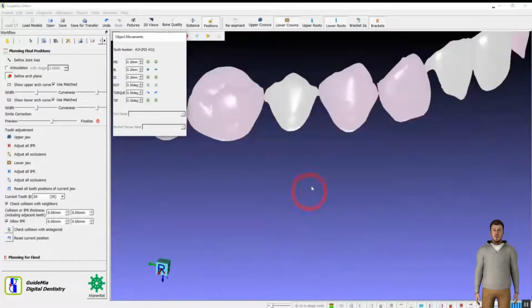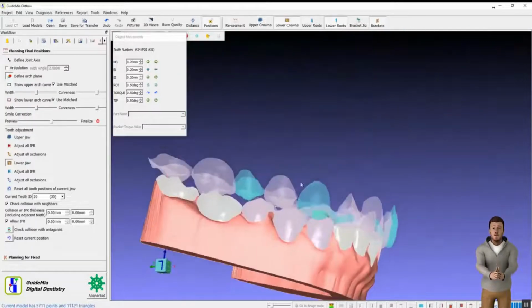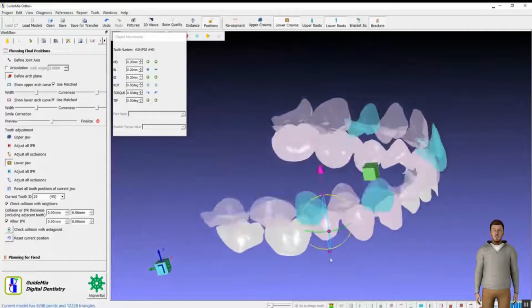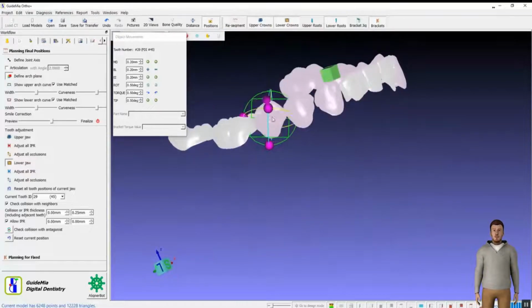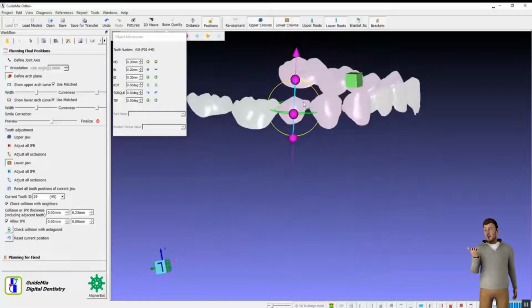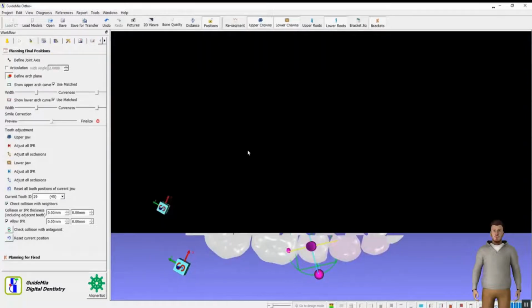In order to print aligner models with a flat platform, an additional step can be taken to add platform features for this purpose. Clicking the Generate button, the system will generate all the files. Another option here is to avoid collisions aggressively during the model generation process. There are times when it is not completely clear to the user if there are collisions in the intermediate steps. This option will help avoid collisions.